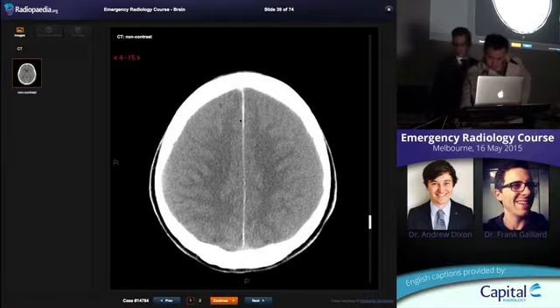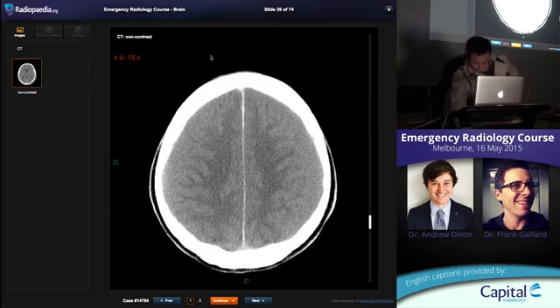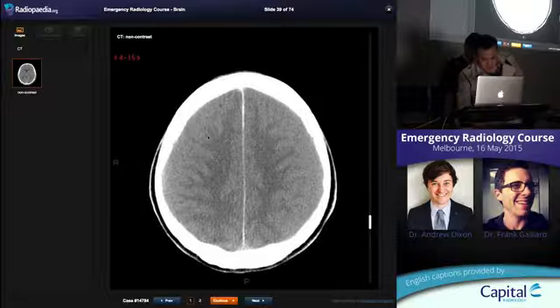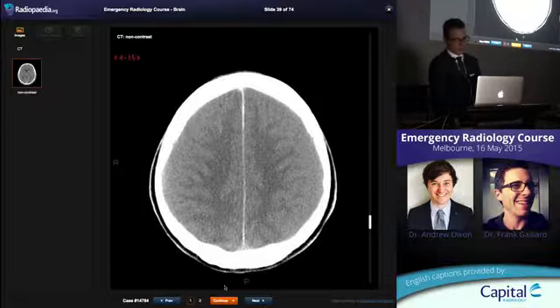I mean, it's bilateral. Subdural hematoma is probably around 7 to 20 days old. And how do you know that that's what it is? Because it seems like the white matter has been pushed medially on both sides. The cortex looks thicker than it should. And the hematoma, which would be on the outside, is isodense to the grey matter. Well done. Excellent. Grab yourself something.